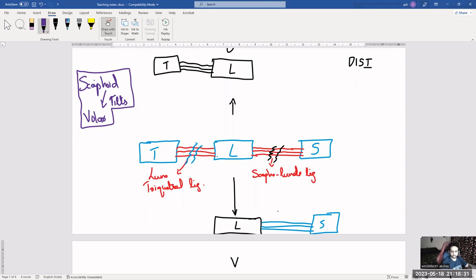So in these two scenarios, the second scenario is VISI, and the scaphoid bone in both cases, as I said, will tilt volar, here as well as here. In this case also, the scaphoid will tilt volar.